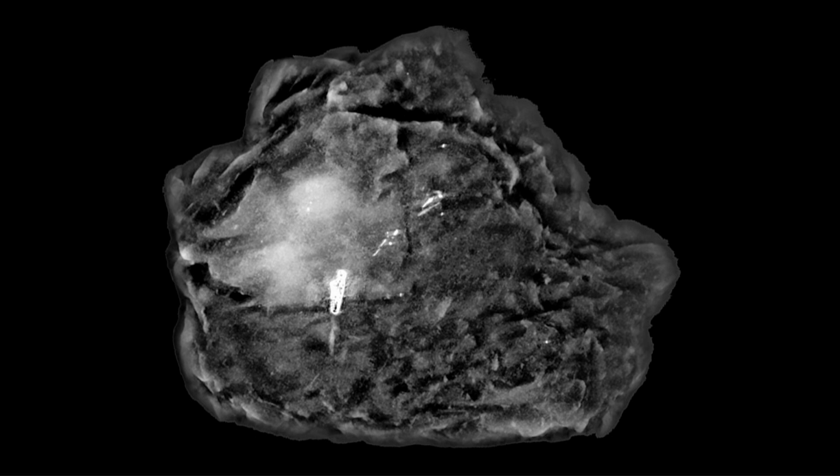This is a seed localization, and I want to make a point here, because at the core biopsy, all that was found was DCIS. But at the surgical excision, and this is the specimen radiograph of the surgical excision, there was an invasive carcinoma, which you can see in the specimen.